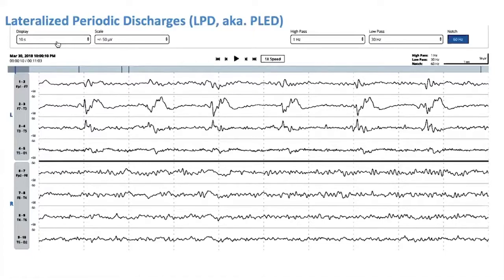And this type of discharge is also epileptiform, but this type of discharge is more common in somebody who has a subacute cerebral injury and is at greater risk for a seizure than a person who has one discharge, or even 6 discharges randomly scattered over 20 minutes. Here we have 6 discharges time locked over 10 seconds. And that timing of the discharges is what raises concern and leads to greater need to keep an eye on the patient for progression into a seizure.